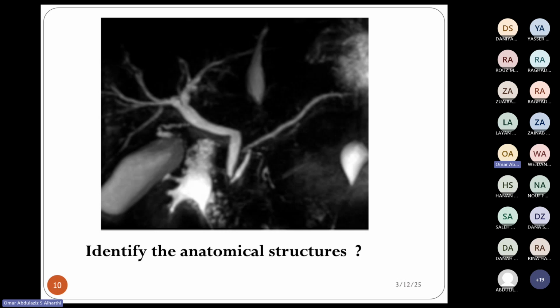What is the name of this exam? Angiography. Try again. So what is the modality? Is this a CT? Is this ultrasound? Is this MRI? Is this X-ray? It's an MRI. This is called MRCP. Have you heard of MRCP before? And what does it stand for? Or why do we do MRCP?